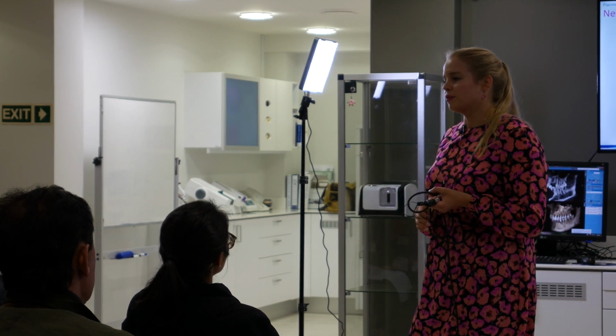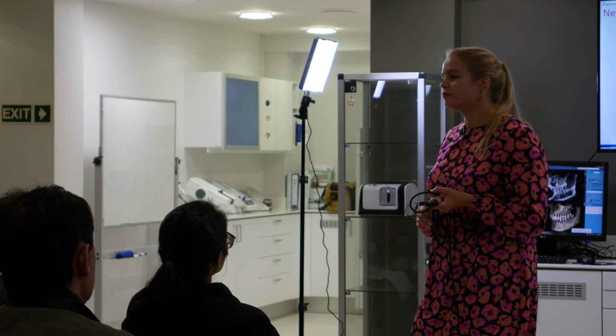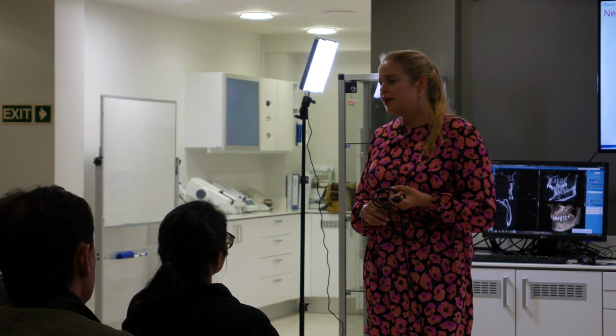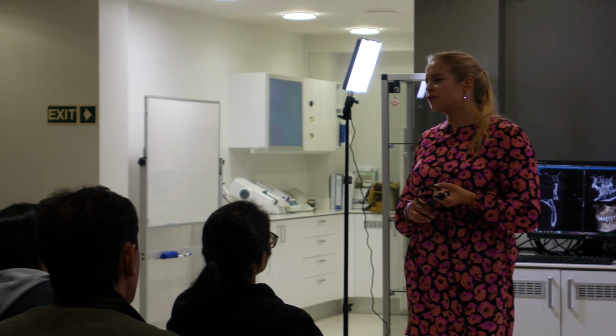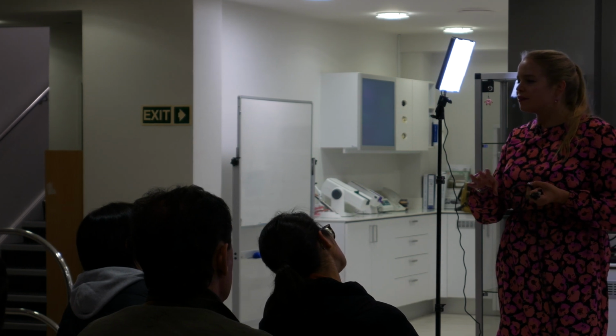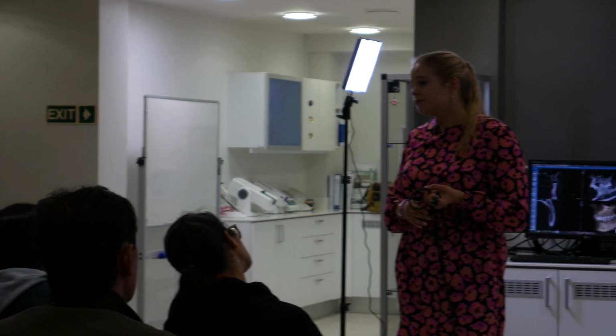Okay. So we have some old tablets that I'm not sure about the requirement. Yeah, I don't know if we have any official ones. Of course, we develop new versions of the mobile imaging application also. So maybe not the very old ones are supported, but yeah.